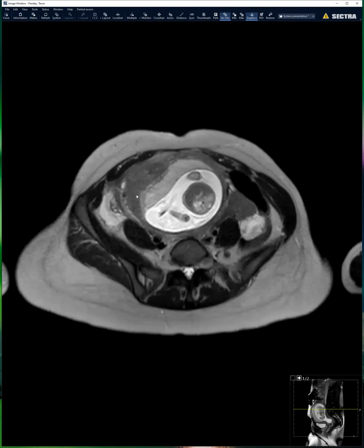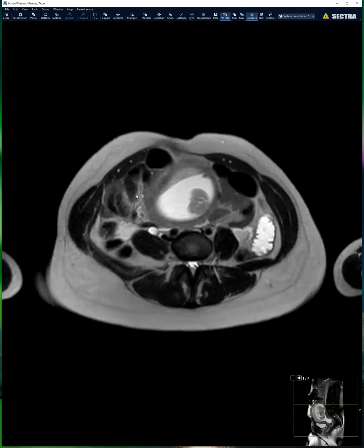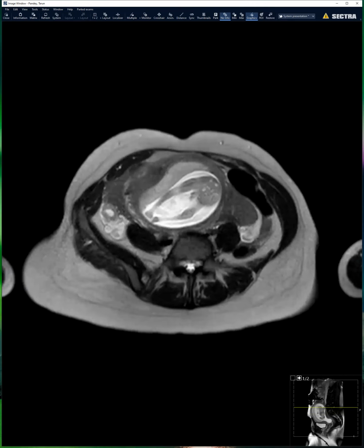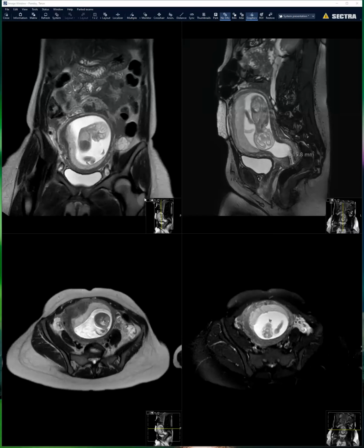I've been faked out before with a contraction, which later on a later image goes away. So that's just one tip for MRI, because we get so many sequences and multiple points in time. That's one way to distinguish a contraction from a fibroid. Yes. Can you show a later point in time? Let me see if I can pull up one second.